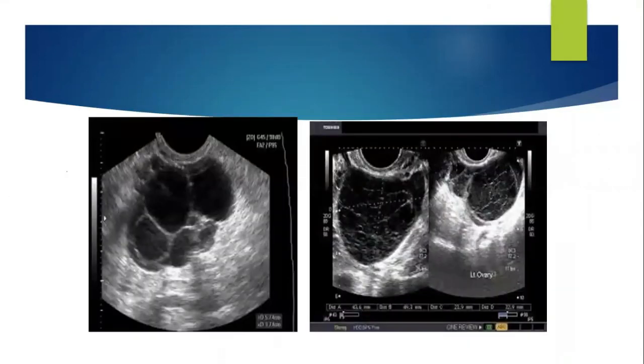But these pictures will give you some idea. These are also normal ovaries with some cystic structures which maybe are physiological. And in our next classes, maybe we'll be discussing that if you see this kind of a structure, which is a hemorrhagic cyst, could be a corpus luteum hemorrhagic cyst, but as soon as the periods come, this cyst disappears. We could have written this off as some kind of a cancer, but that actually is not a carcinoma, and it's simply a hemorrhagic cyst, which is going to disappear once the period starts.